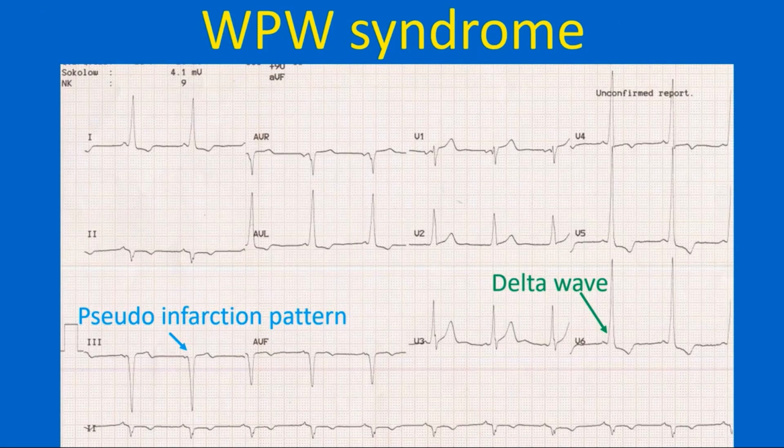This ECG has a superficial resemblance to left bundle branch block with tall slurred QRS complexes in lateral leads. The QS complexes in inferior leads mimic inferior wall myocardial infarction. Actually, it is a non-infarction Q wave or pseudo-infarction pattern.